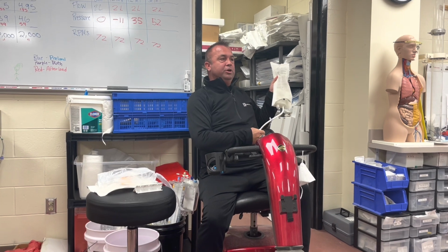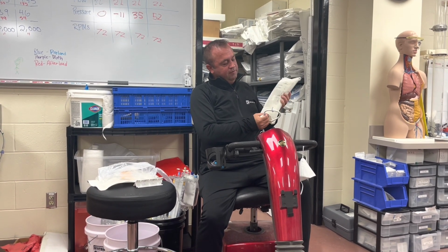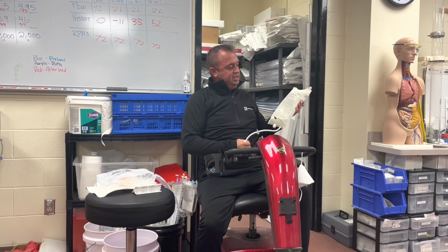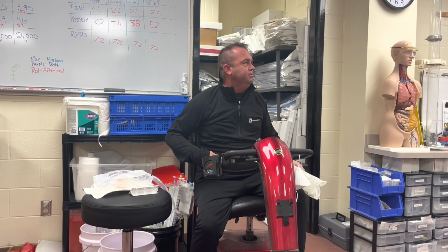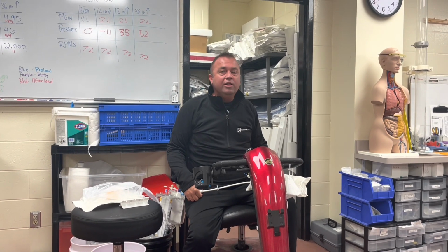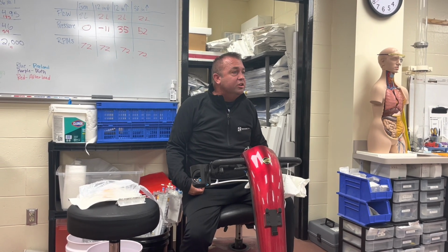Okay, so the next thing is we have that in there. We have a built-in pump to pressurize that. Anybody know how high of a pressure we need to pressurize that to avoid dampening and so that still flushes? Any idea what the pressure will be? About 300. Why do we want to pressurize this to 300? It needs to be well above something. What does it need to be well above? Our patient's systolic pressure, right?